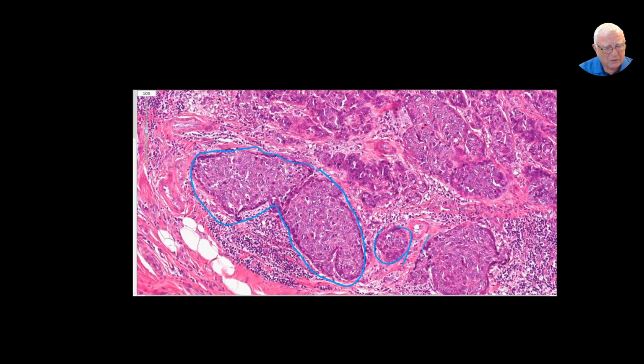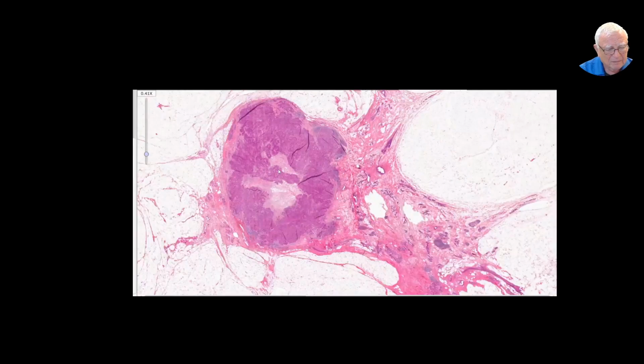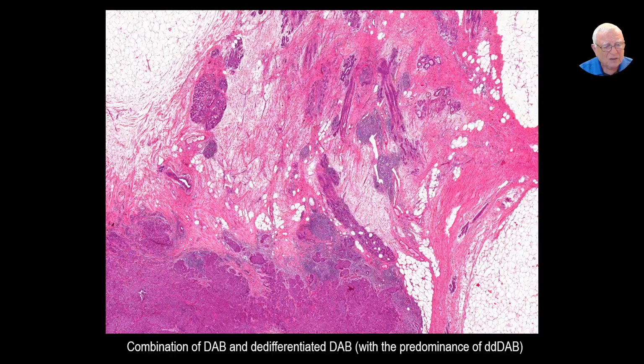You see the lymphocytic infiltration. This is step 2, but what dominates the picture is step 3. Then calcify. Look inside. What a mess. Apoptosis, viable cancer cells, disconnected cancer cells, detached.